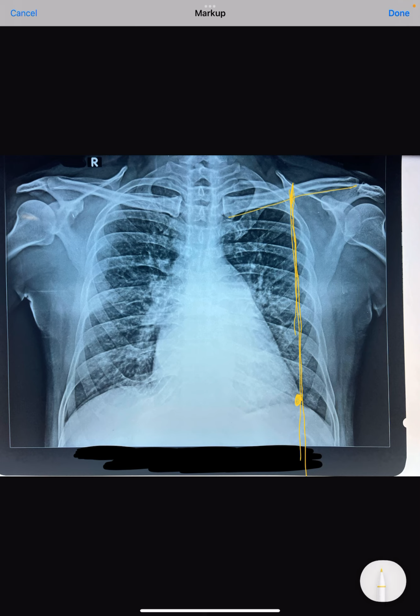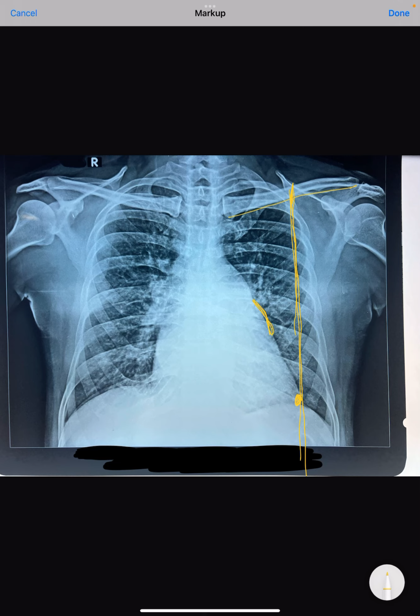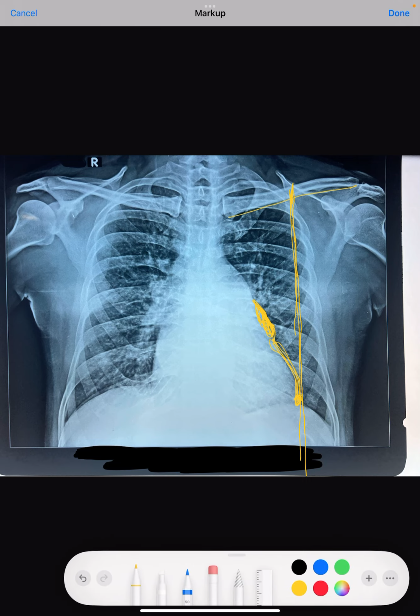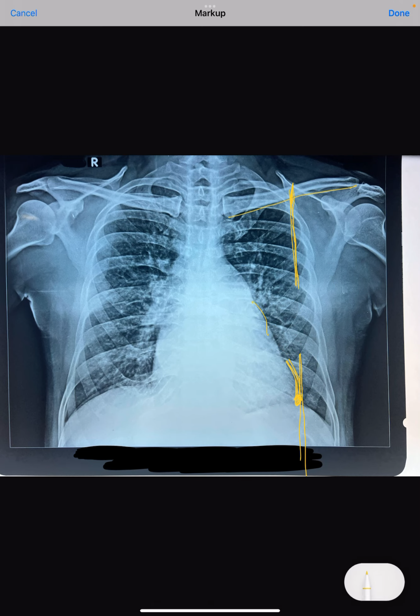So it is not crossing, but if you notice, this is the left atrial area, this is the left ventricular area, this is the left atrial appendage area, which is pretty straight. It means there looks to be left atrial enlargement.